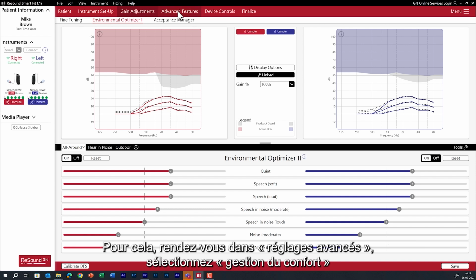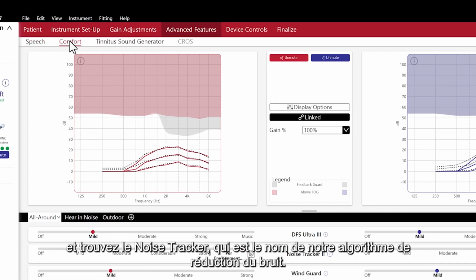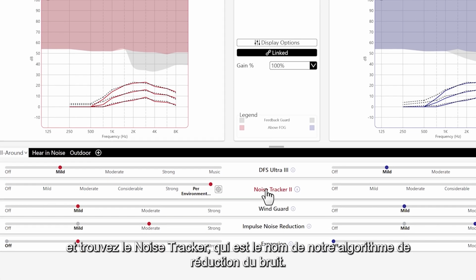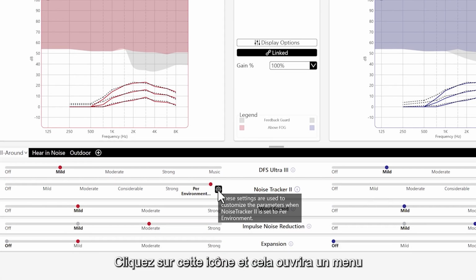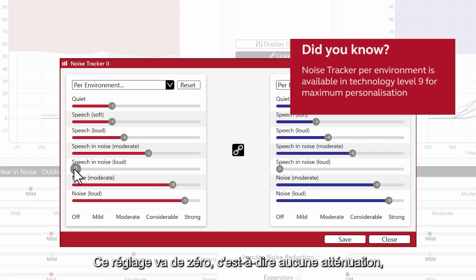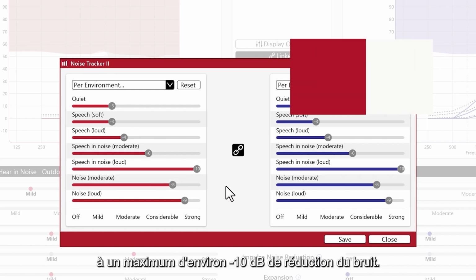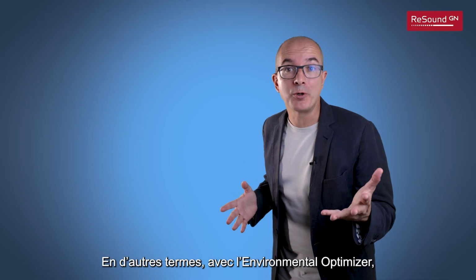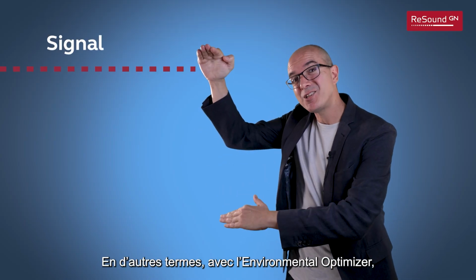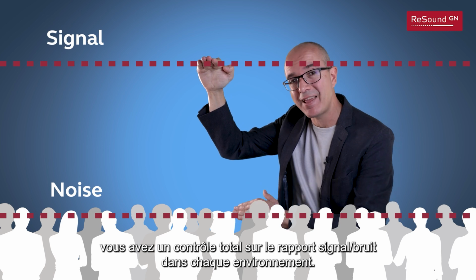For this, go to Advanced Features, select Comfort, and find the Noise Tracker, which is the name of our noise reduction algorithm. Click on this icon and it will open a menu where you can adjust the noise reduction per environment. And this setting goes from 0, that's no attenuation at all, to a maximum of about -10 decibels of noise reduction. In other words, with the environmental optimizer, you have full control of the signal-to-noise ratio in each environment.